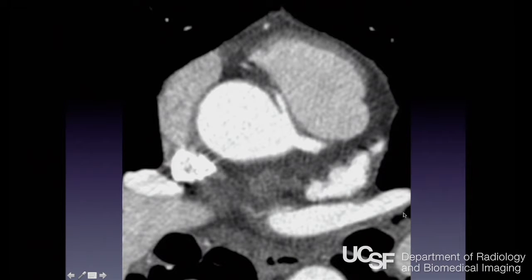Briefly on coronary arteries, I'm not going to spend a lot of time on coronary arteries, but I'm going to touch on this thing because I think a lot of this is not really super well understood. And so here's a patient presenting with chest pain. And we do coronary CT, most commonly to look for atherosclerotic disease and obstructing lesions. But occasionally we see this.